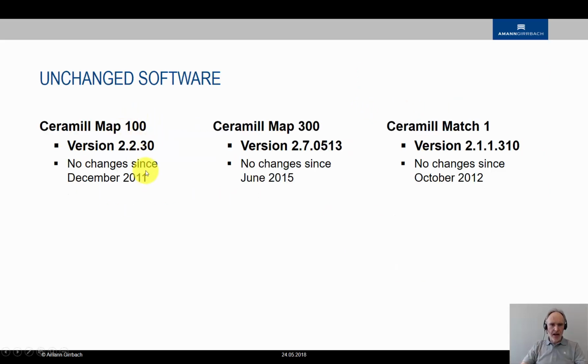No changes are in the Map 100. It's no change since December 2011. Then no change in the Map 300 and in the Match 1.